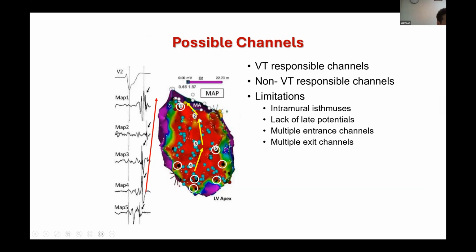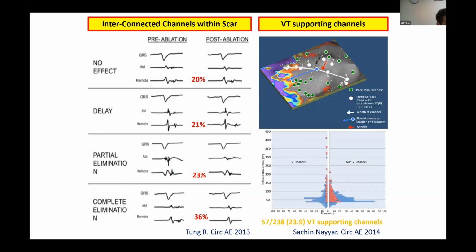This is also very easy, just like what we did for the island, but for a different purpose, because you just annotate so that you can search for a sequence and understand that probably this is the potential channel.